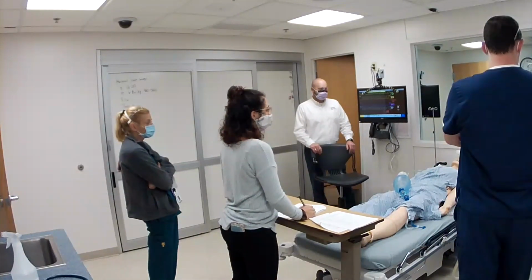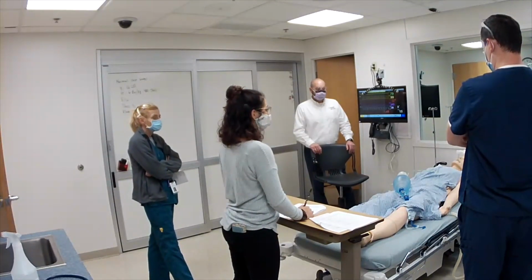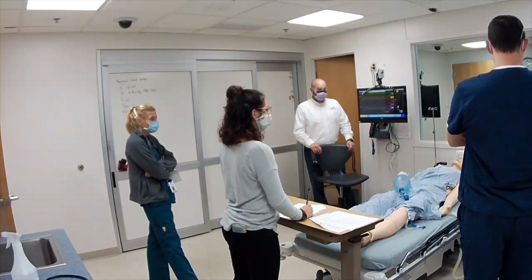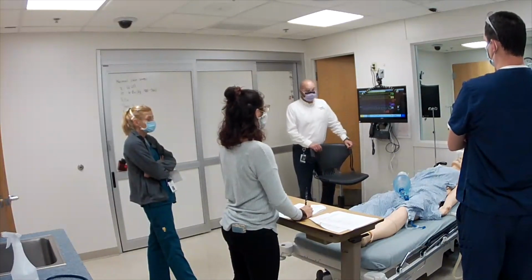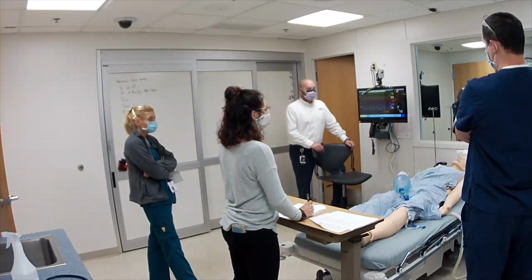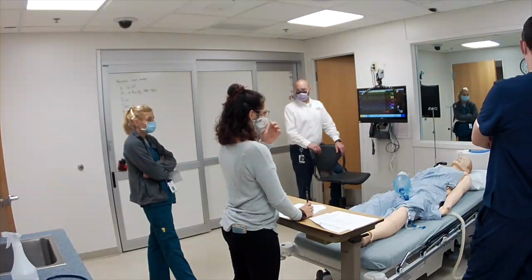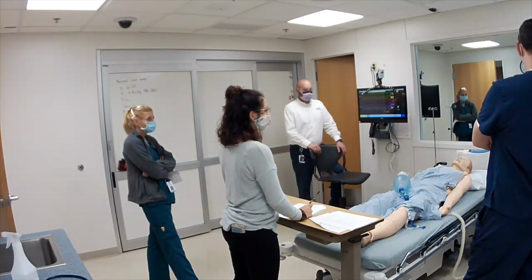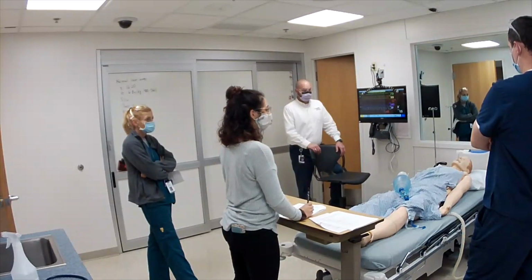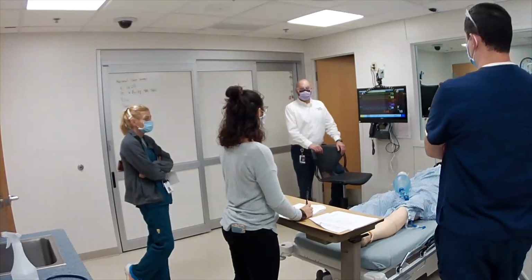Well, what we've given would be MVI, right? What the patient has received. Yeah, absolutely. In a minute. So why do I care a lot more about MVE than MVI? Because what the machine might be giving the patient, if you have a leak, the patient might not be seeing. Okay, yeah, so MVE tells us what I know for sure participated in gas exchange, right? Because it was in Stanley's lungs and came back. So I like MVE a lot more.